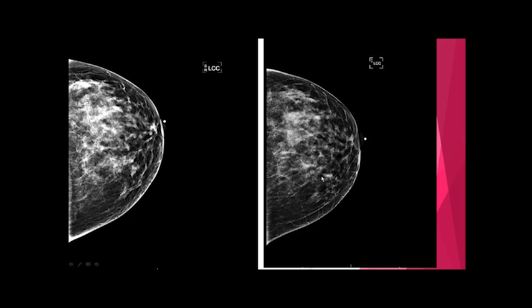And guess what else they did? They got more compression. Do you see the difference between better compression and inadequate compression? The structures are more clear. There's not as many summations. Of course, I know tomosynthesis helps with that. So there's not as much superimposed tissue when the computer separates the image slices. But you could see she did a better job.